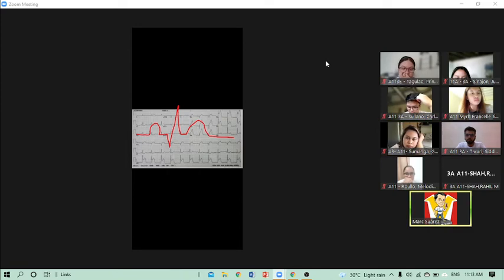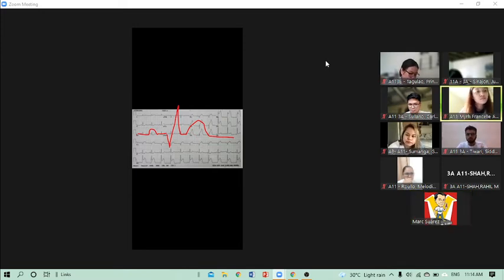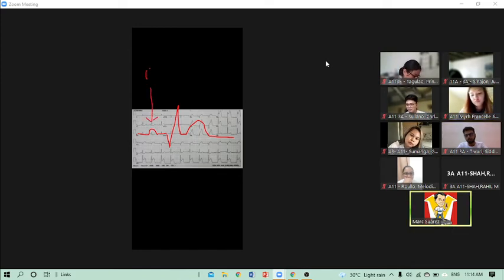Okay. So any questions? The P is supposed to be small, ha? This one, let me edit it so it's clear. So the P is supposed to be small. Okay, much better. So this one is the P wave. Okay?